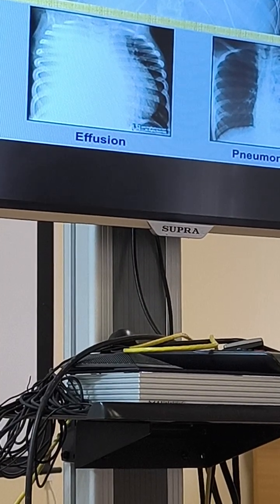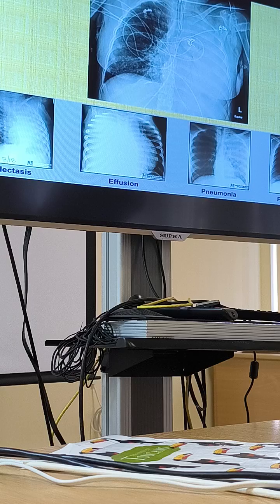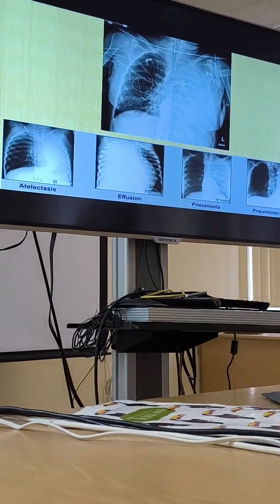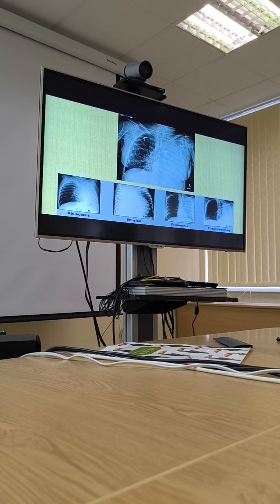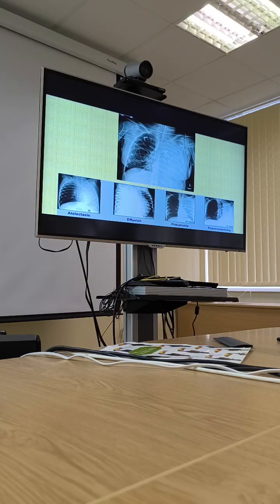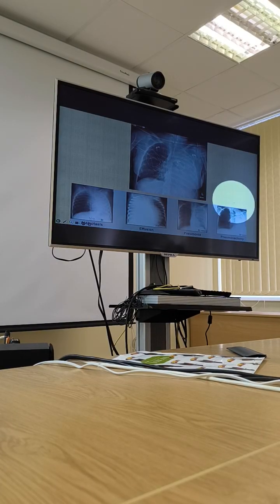So what is this type of opacity named? What is important in this opacity? It is big. How do we name these opacities? Extensive opacities, remember? And what should we pay attention to with extensive opacities? The position. First of all, is it unilateral or bilateral? It is unilateral. And what should we pay attention to? The position of the mediastinum. And remember, displaced in the direction of the disease, atelectasis or a situation after pneumonectomy.